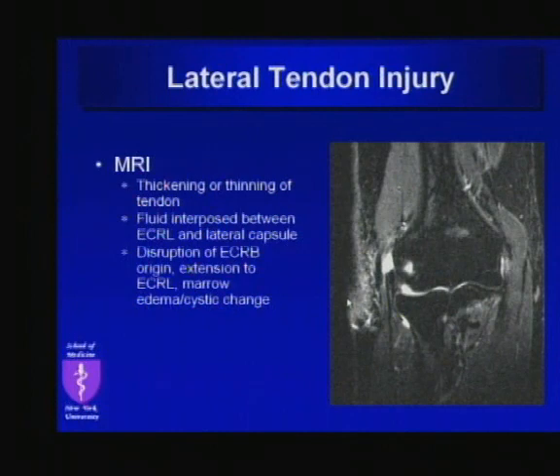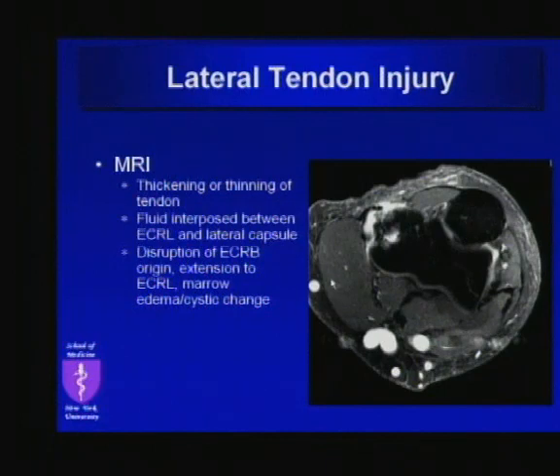Now, if this disease process progresses, it can have other implications and other imaging findings. It can start in the extensor carpi radialis brevis and extend more superficially, disrupting the origin of the extensor carpi radialis longus as well. This particular image here also depicts a commonly associated finding with severe lateral epicondylitis, which is underlying bony changes. You can see those findings here. You can also see it beautifully depicted in the axial plane here. So the bony changes here, marrow edema, and focal fluid here with partial disruption of the common extensor tendon.